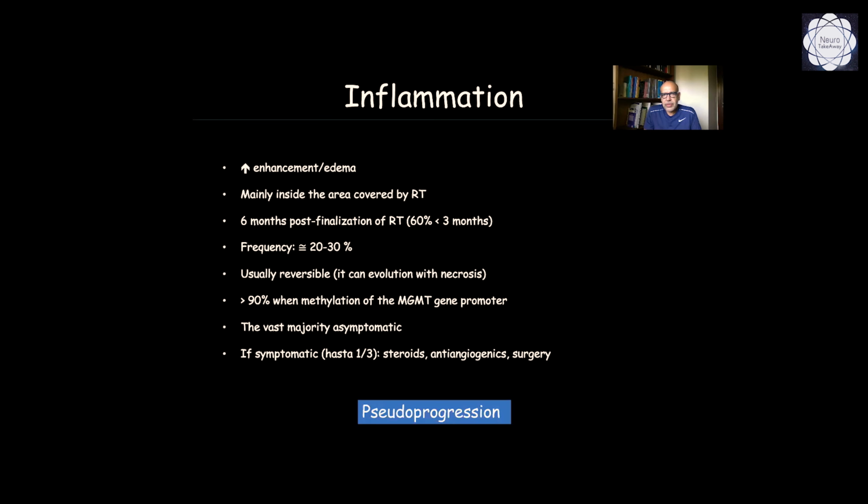Regarding inflammation, inflammation is a very common sign after treatment with chemo and radiotherapy. Many years ago, a new concept was introduced, which was pseudoprogression. Pseudoprogression is the presence of edema and an increase of the enhancement after treatment. It occurs mainly inside the area covered by the radiotherapy frame.